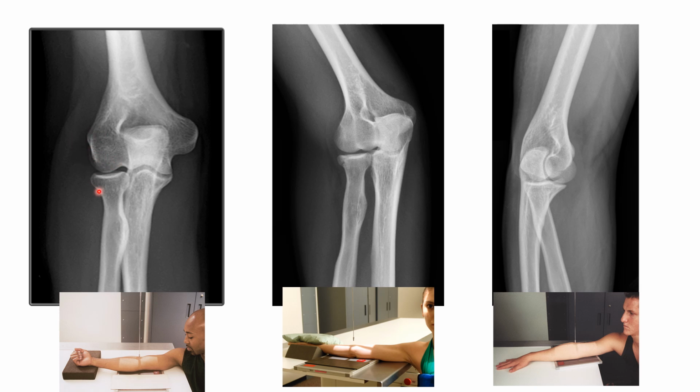We'll also be looking for the olecranon to be seated in the olecranon fossa, and the joint space between. You can see where the capitulum sits on the radial head, and then you can follow around to where the trochlea is, right there where the ulna is wrapping around the trochlea. We can see that the joint space is open, and this tells us that the arm was fully extended and that the arm was parallel to the IR.